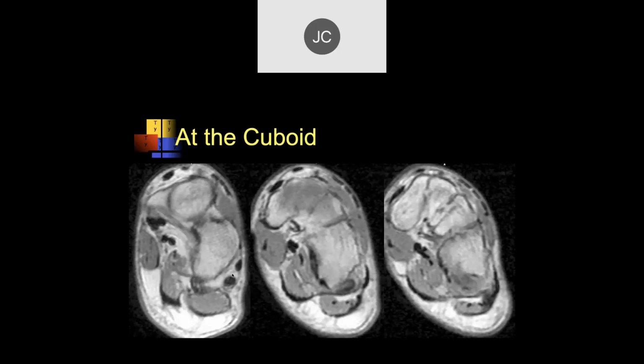Okay, looking at the middle image, the peroneus longus as it comes under the cuboid looks tendinotic. Not sure if it's torn, but here's before it gets in there, and now it's at the level of the cuboid, and here's distal to the cuboid, really more plantar to the cuboid and through here, where it's going to extend across and attach right over there.